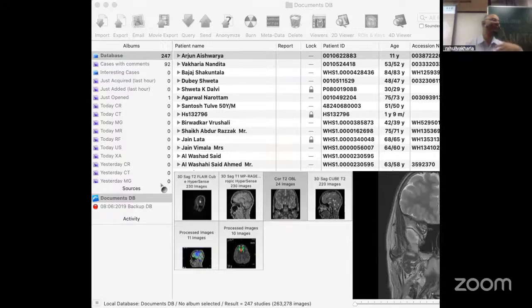So basically, T1 weighted imaging is used to see the normal anatomy of the brain, where your CSF is darker. On T2 weighted imaging, you usually see the fluid as brighter. T2 is used to pick up the pathology, and T1 is used to see the normal anatomy. That's the basic of it. Then there are multiple sequences, but let's not get into MR.